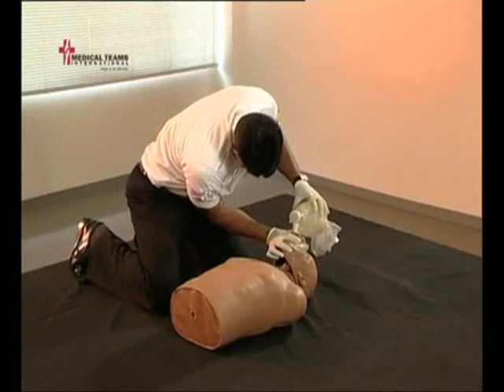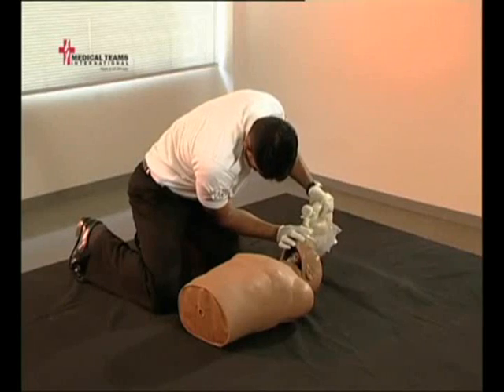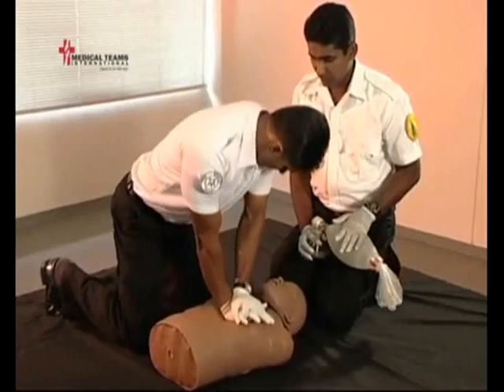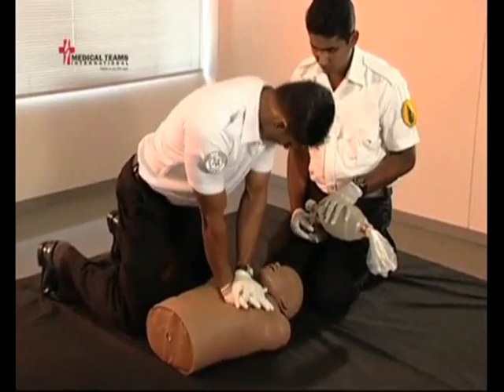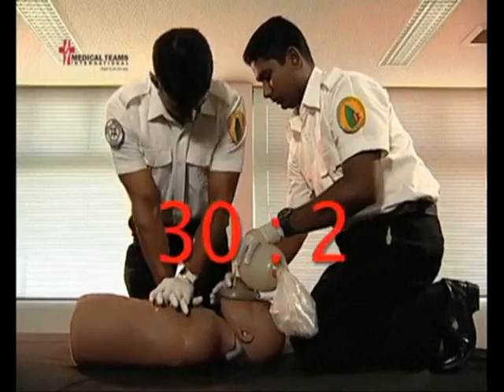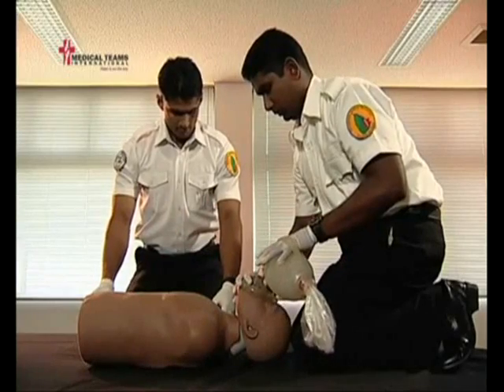If 2 EMTs are available, then 2-person CPR is preferred. The first EMT will provide the rescue breathing component, and the second rescuer will do chest compressions. With 2-person CPR, use the same compression to ventilation ratio of 30:2. To prevent fatigue, you can change the roles of compressor and ventilator every few cycles.